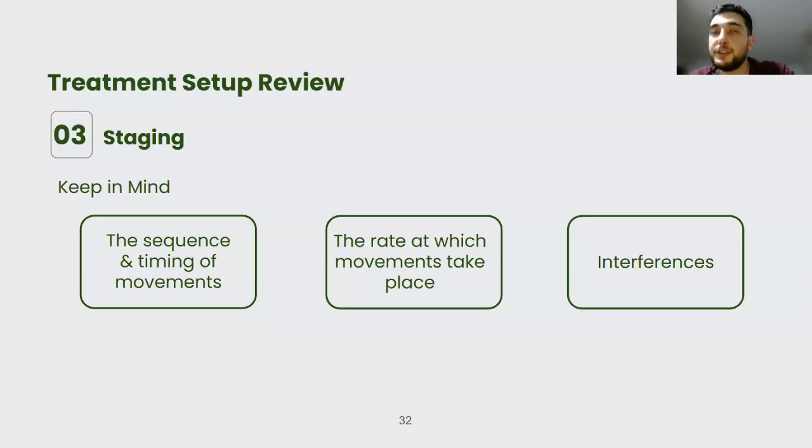Sometimes we're going to go against this order, for aesthetic concerns of the patient. When the patient wants to start treatment and they have an open bite, they want the chief complaint to be treated as early as possible. And this is important to keep the patient compliant, because if the patient is wearing many aligners and there is no improvement happening anteriorly or to the chief complaint that the patient is suffering from, you're going to lose compliance, and this is going to affect the overall treatment. So sometimes it's okay to go against the usual order in order to address the aesthetic or chief complaint of the patient, and this will reinforce the patient's compliance and the success of the treatment overall.